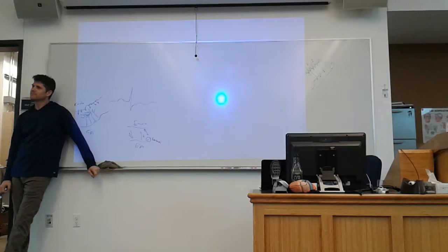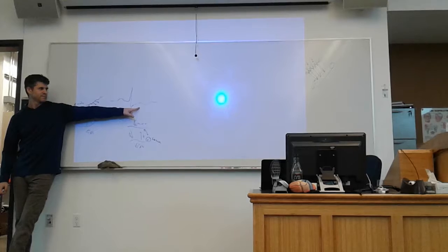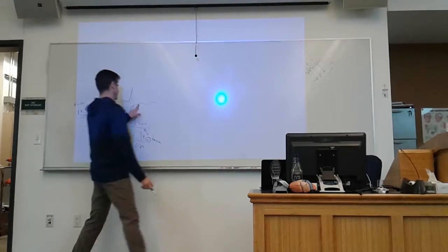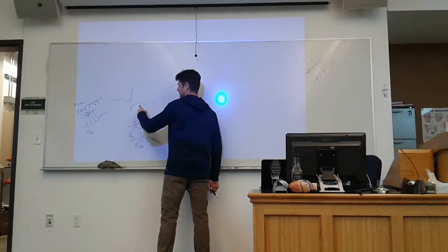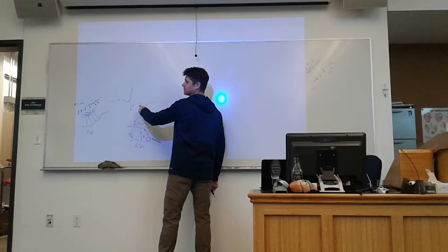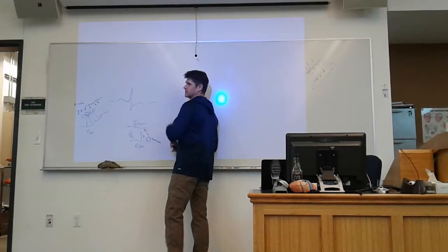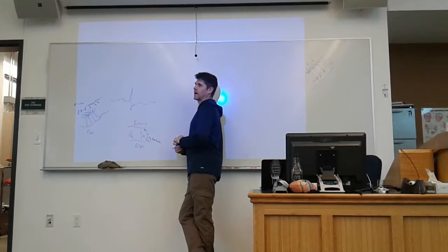Yes, ma'am? Okay, so looking at that image that you just drew, where your finger was just a second ago, that looks like it could be an upright T wave that's just depressed below the isoelectric line. But it's not. It's then an inverted T wave right there. Correct.